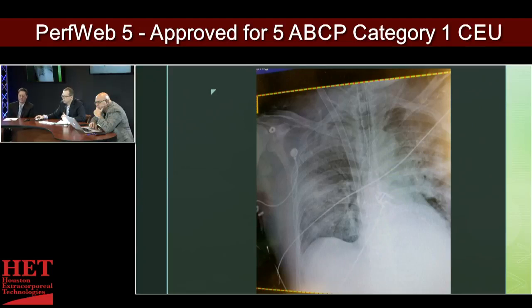And so you know that it's coming down, and what you want to look at with this Avalon cannula is you want to make sure that the tip of the cannula doesn't take a hard left turn into the atrium or into the right ventricle, because I have seen an RV perforation from this type of cannula before. That's catastrophic. Yes, I was thinking that would be bad.